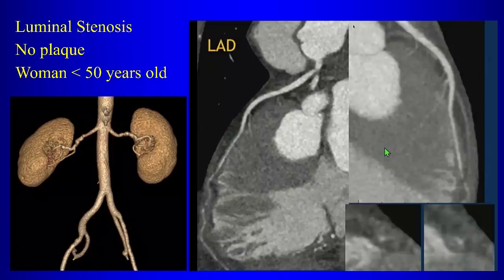Yeah, so this patient has fibromuscular dysplasia. So what's your diagnosis then? What's wrong with the coronary artery? What am I showing you? Vasculitis? No, that's not what I'm showing. This is an acute event. What is this? Vasoconstriction, like a vasospasm? Not a vasospasm, no. Dissection. Yeah, this is spontaneous coronary artery dissection.